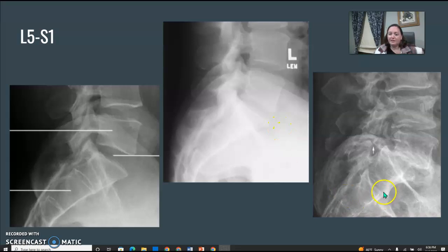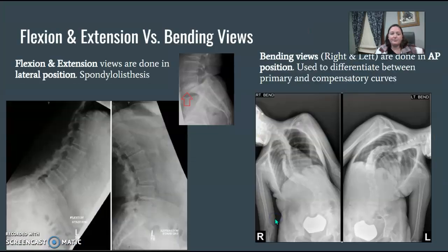This patient is very rotated and kind of kicked forward. You can see the vertebrae. We can see the posterior ends of it. This patient doesn't have really much of an L5S1 space at all because this is a really rough spine. But most likely they didn't angle, or the patient maybe didn't need an angle. So if you get this error, you might just want to swap those, whichever one you did.